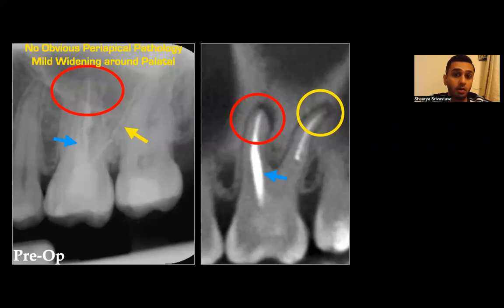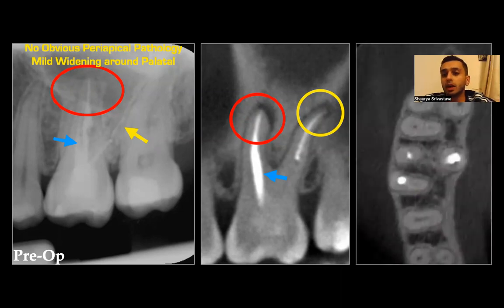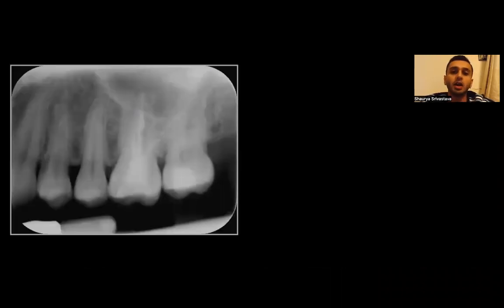So that's one thing to remember, okay? You cannot only rely on CBCT to look at the quality of your root filling; you must be looking at 2D as well. And again, as we just spoke of, there's an MB2 here, but is that the reason for failure? It's not the only reason for failure. It's just not a well condensed root filling. It's not been done well enough.